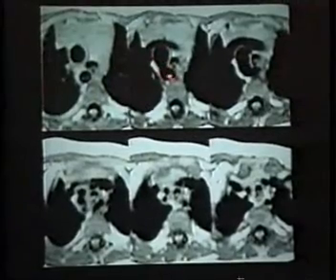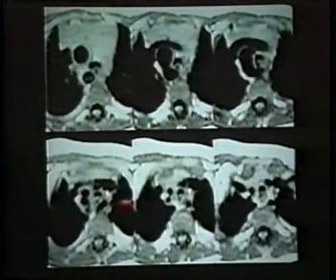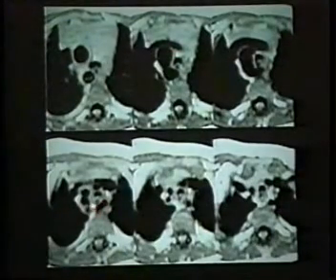In the right aortic arch with aberrant left subclavian, there should only be a right-sided impression in the frontal esophagram. As you recall, in this patient with a double aortic arch with left arch atresia, there were bilateral impressions. It was of interest in this patient that I thought that he had a double aortic arch because as I followed the ascending aorta, descending aorta, into the arch, I thought that the left subclavian, as it originated posteriorly from the ductus diverticulum, was tethered anteriorly.